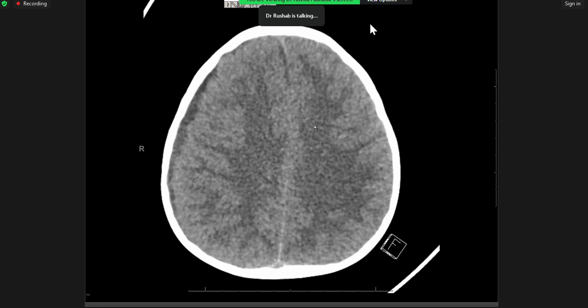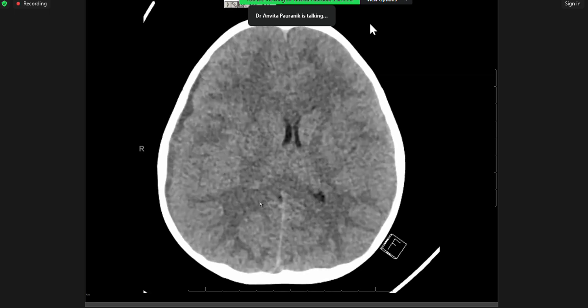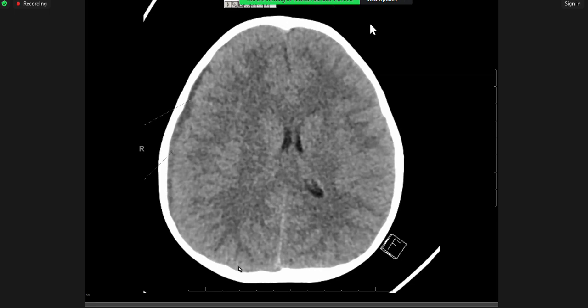Meningitis or related subdural pus collection or empyema. Meningitis is technically in the leptomeningeal spaces, but when you have a collection confined to the subdural space, you will call it a subdural empyema, right? And yes, that is also right. You can have a sterile effusion secondary to meningitis, and it can be hard to tell on CT alone whether this is sterile or infected. But you look at the degree of the mass effect. Such a bland collection will not be able to cause such massive effacement and mass effect. So that's the number one clue.